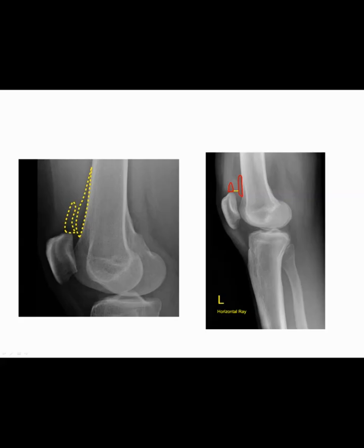Also, on the lateral femoral condyle, there is a condylopatellar sulcus, also known as the lateral notch, whereas once again, the medial condyle will have a convex distal surface that won't have a notch.